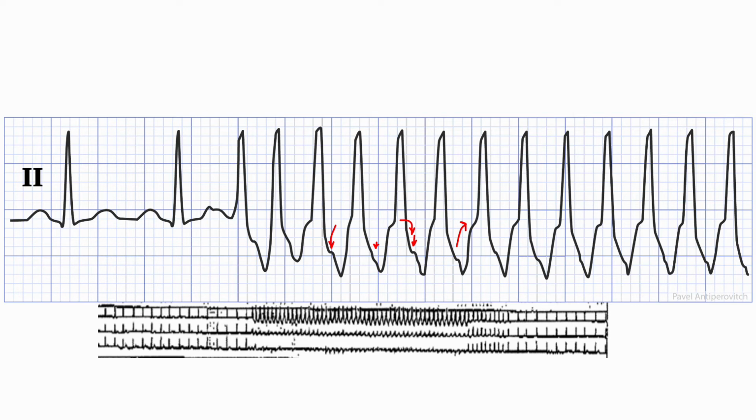But interestingly, we have the initiation here, and it's often helpful to see how does it start. The first event of this tachycardia, the first early event, is this. Okay. And I know there's a P wave in there because I have a sinus T wave, and so I can template the sinus T wave with this T wave, and there's clearly an extra notch there that was not there before. So this is, and it's high frequency, it's much sharper than a T wave, so it must be some sort of a depolarization, so it must be a P wave, okay?